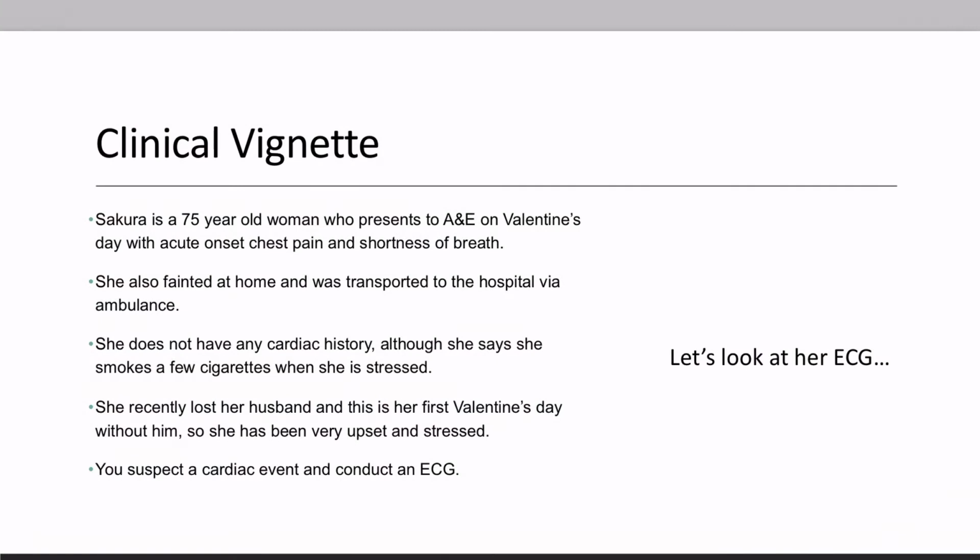Hello and welcome back to this week's ECG of the week. Take a second here to pause the video and remind yourself of this week's clinical vignette. Now let's take a look at the ECG.